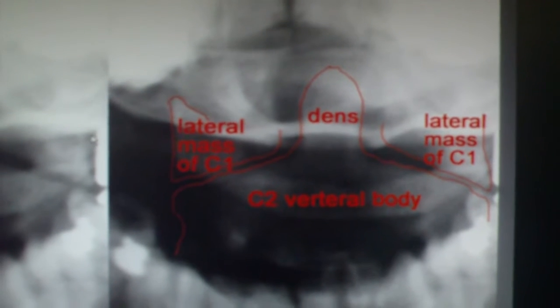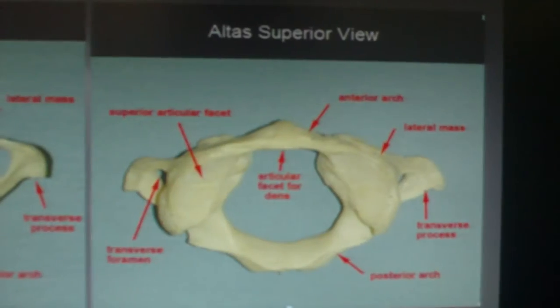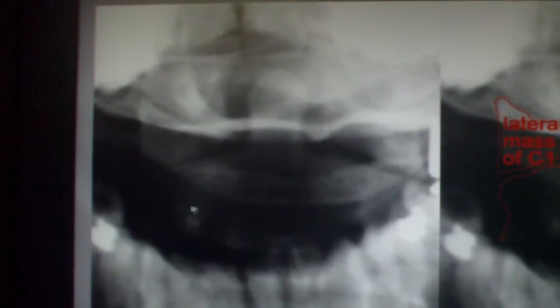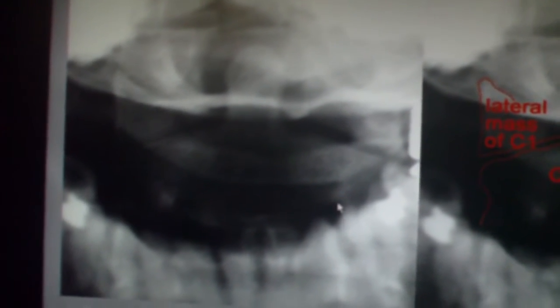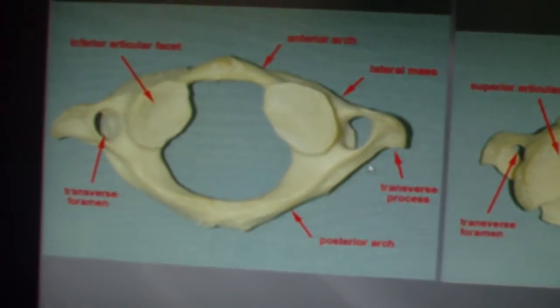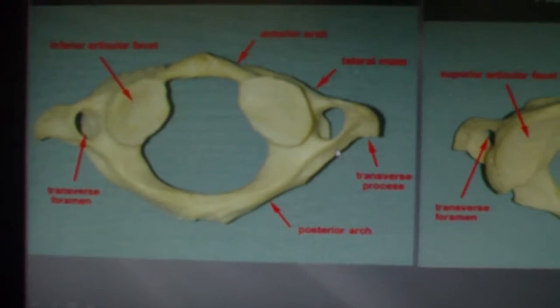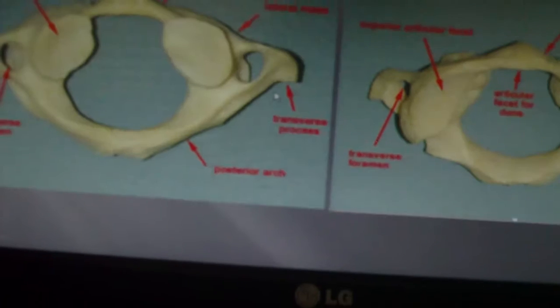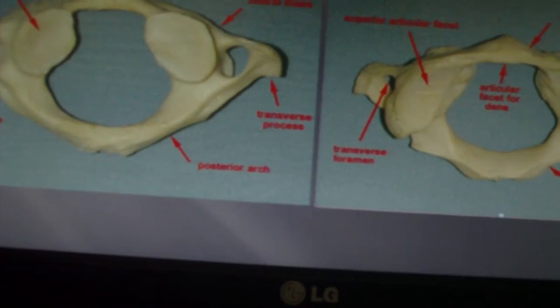Okay, so you've got all of this stuff. Here, go back to this. Here was the pedicle, most of you got that. Again, if on the test I've got something that's obscuring what you want to see, look to the other side, or look above, look below, and see if you can find a comparative structure. I'll point that out though. We don't have any projections that are like this other than on CT or MRI.